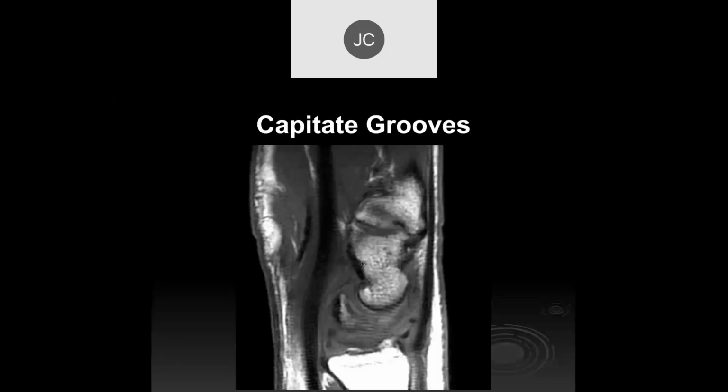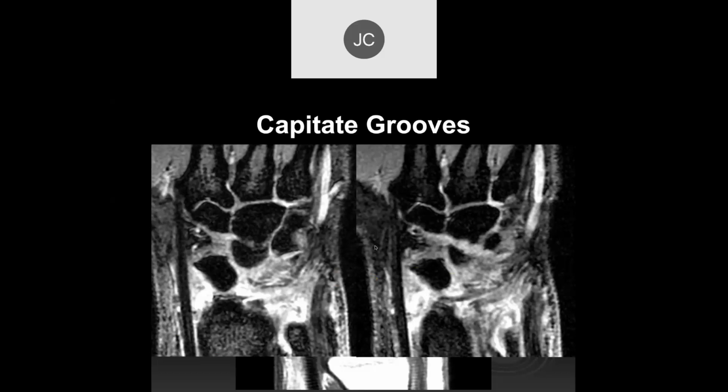And on the sagittal images, you can see indentations both volarly and dorsally, which, when viewed in the coronal plane, can sometimes look like erosive changes. So you need to look at these in multiple planes. And then again with MR, if it's someone who's not on TNF-alpha inhibitors, you need to look for the inflammatory changes, which is something you can't see by CT.